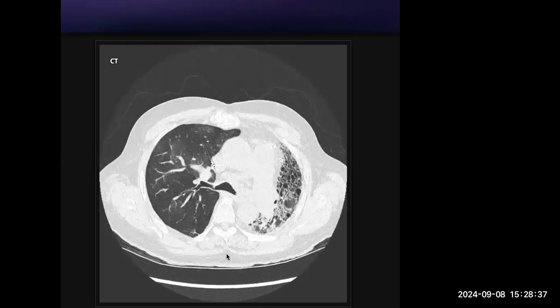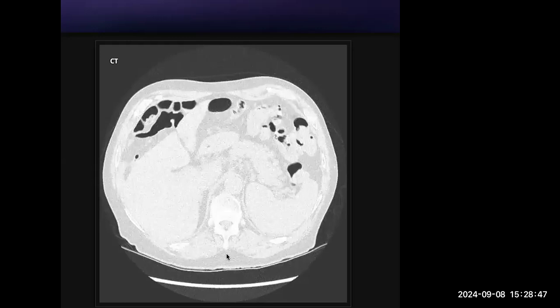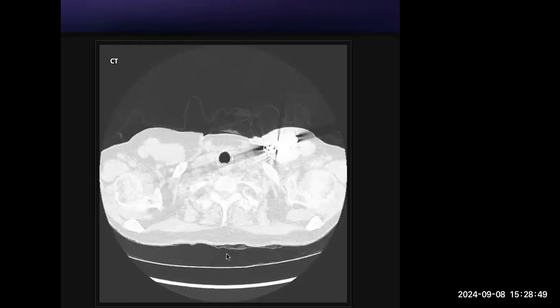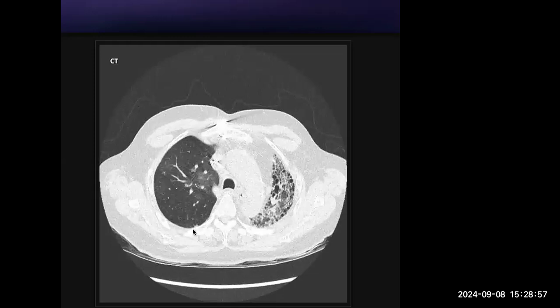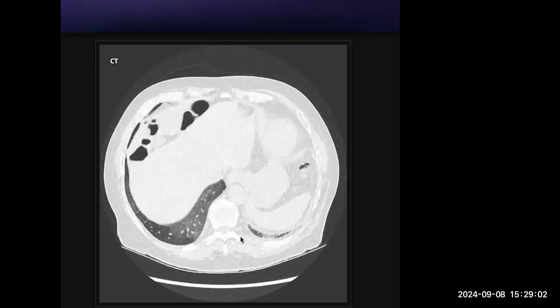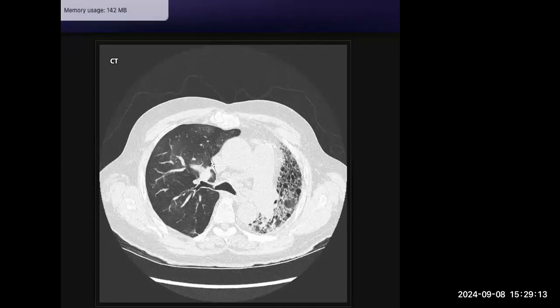So in the expiratory CT, I think there is some air trapping. So the possibilities could be a bronchiolitis if the patient has any history of pigeon exposure or some organic dust exposure. It could also be due to hypersensitivity pneumonitis, or it could be a case of respiratory bronchiolitis. In a lung transplantation patient, they have a tendency for graft versus host disease, so it could be due to obliterative bronchiolitis. And then again, hypersensitivity pneumonitis, sorry, not pulmonary hypertension, basically these two differentials.